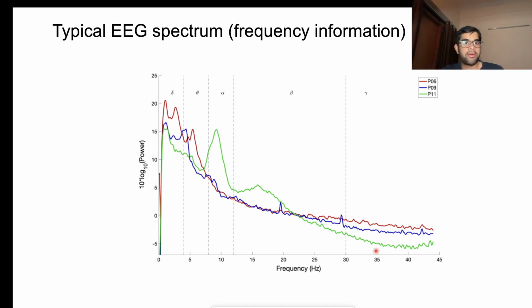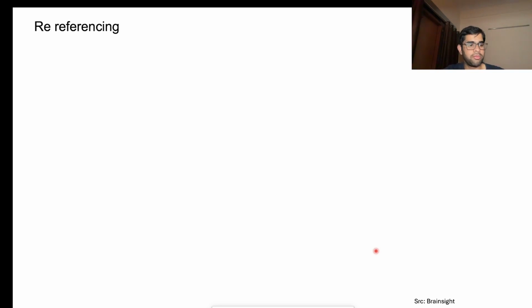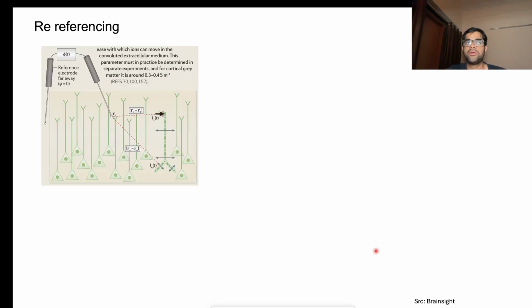So I thought to talk about re-referencing also, but I can talk about 5 more minutes and then we'll close. So why do we do re-referencing, as we have seen in the previous notebook. Let's say you have an electrode. It's not the absolute potential that you're measuring using these electrodes. Any potential that you measure is with reference to some other position, or some other electrode. That is nothing but the reference electrode, or if you have an EEG system, the reference or ground of that EEG system.